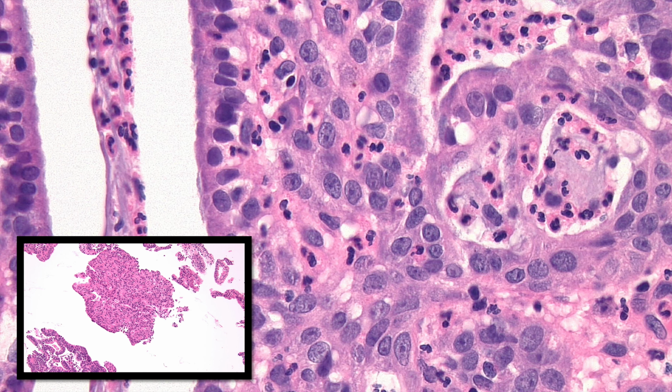Why is this important? Well, it's important to recognize because there are some endometrial cancers which show features of microglandular hyperplasia, and I've put one in the bottom left-hand corner there. And in older patients, you should make this diagnosis with caution. Microglandular hyperplasia is a change that's normally associated with younger patients, especially those who are pregnant or on progestin therapy.